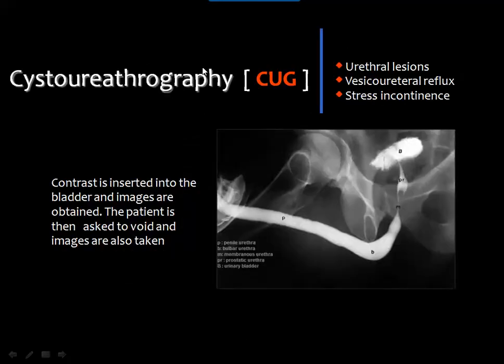This is also another examination, which is known as cystourethrography, and this examination is performed by putting the tip of the catheter at the tip of the urethra, and we inject the contrast media. We usually follow the injection under screen control until we opacify the urethral segments, and we have films. Then we may continue injection of contrast to fill the bladder, and after that we may ask the patient to void on the radiography table and to show the micturating urethrogram.